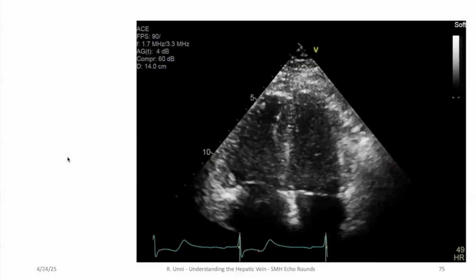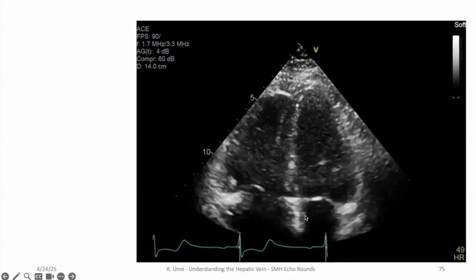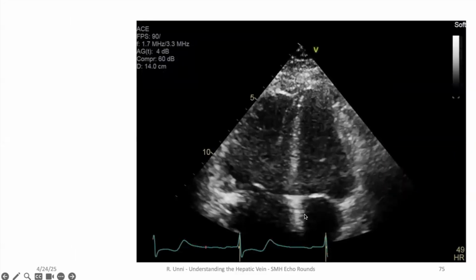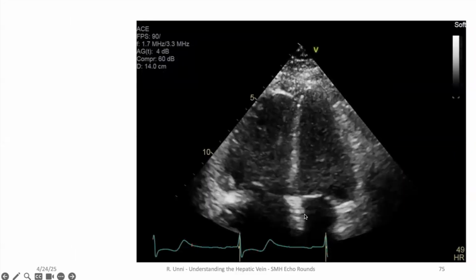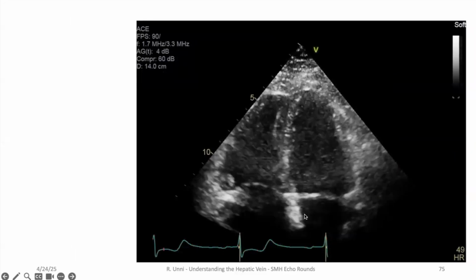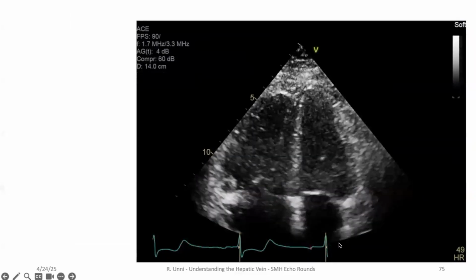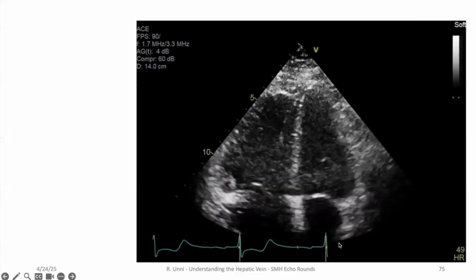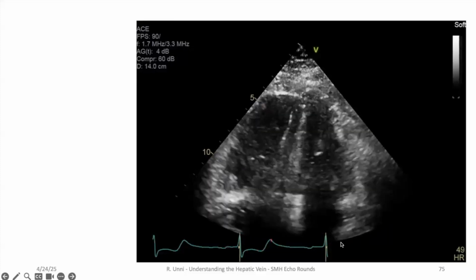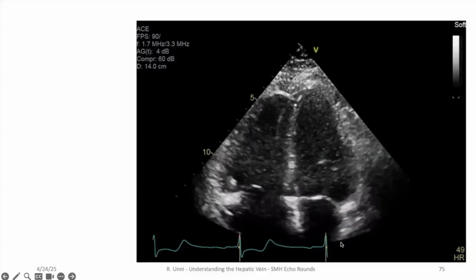Okay, let's keep going. Here's a different scenario. This is a patient coming in with an inferior STEMI and a big right ventricular infarction. You can see that, wow, that RV is really not doing too much. If you look at the atria, it's also very dilated and not contracting as well. This patient is in sinus rhythm, and just so you know, he's got a history of paroxysmal atrial flutter with multiple RA ablations for atrial flutter. So, a known scarred, big RA.